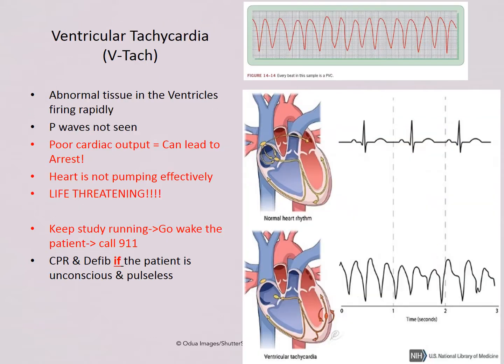Let's go on. Now this is the one I was just talking about, ventricular tachycardia. Notice how the picture at the top of the screen, those waves kind of look like PVC just repeating itself. That is exactly what a PVC could possibly lead to, and so that's why you want to keep a close eye on your patient when you see one PVC. But one PVC in and of itself is not a concern. It's only when you see this pattern.